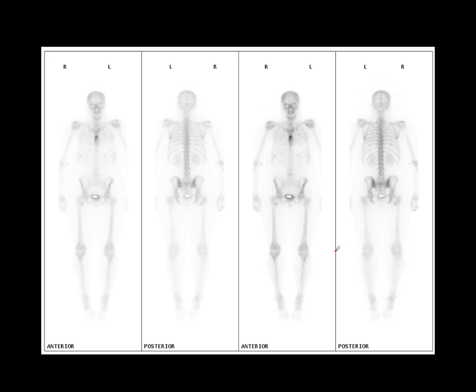Okay, so we've seen a couple of sternal abnormalities already, but I just thought we'd get through a couple here. So we saw that there's normally a small area of focal uptake at the manubriosternal articulation. That's a normal variant, but also we saw the transverse band of activity from a fracture. Now, if you look in this case, you can see it's quite asymmetrical, with slightly more prominent activity on the right-hand side compared with the left.